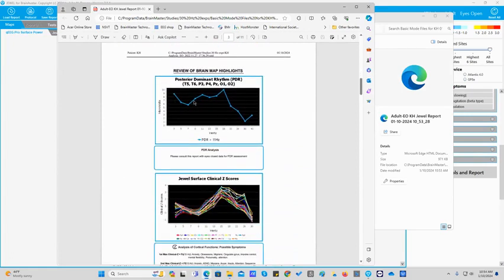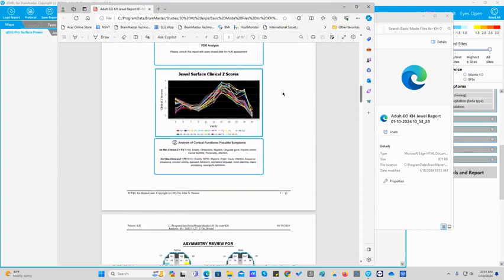Here is a flow of data that indicates the dominant rhythm of the brain. Here's the flow of data in Z-scores, and the peak Z-score is noted, which would be FZ at 15 Hertz. And these are likely, but not definite symptoms that may go along with 15 Hertz beta at FZ.